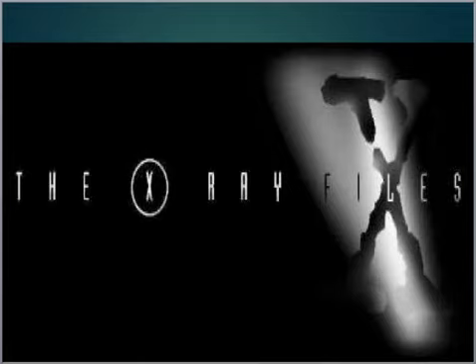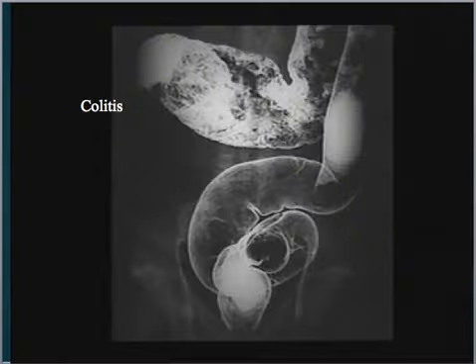So this first image that we're going to see is of the large intestine. It's a little dark and hard to see, but there's the pelvis down here. Here's your rectum, your cecum going up to your descending, and your flexure would be up there. But right here in the transverse colon area and the right flexure, you can really see all of this inflammation. This is colitis.